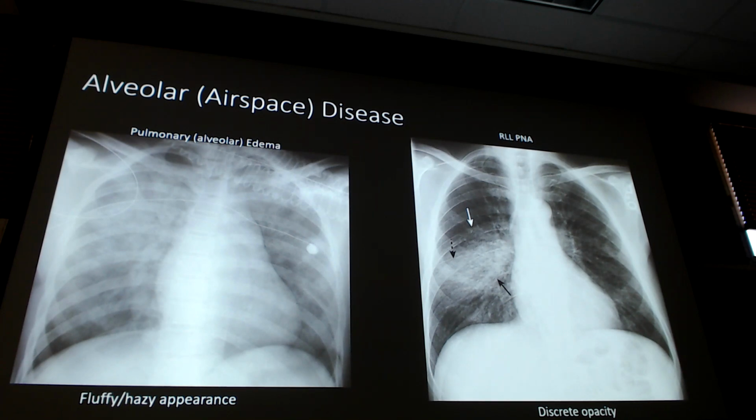You're like, wow, so with the peribronchial cuffing, I just get that nice little circle, right? It just surrounds it. This is a little bit more involved, and it's actually laying in the alveolar space. And you're like, oh, I can actually see that whole bronchiole. I can trace it out. That's an air bronchogram. We'll see some other ones, but I wanted to point that out because it's pretty subtle, but that's what it looks like.